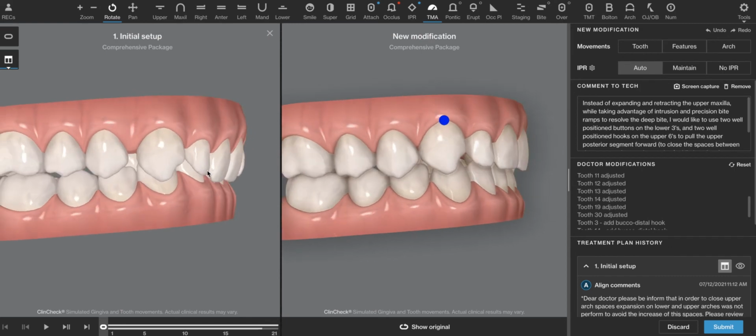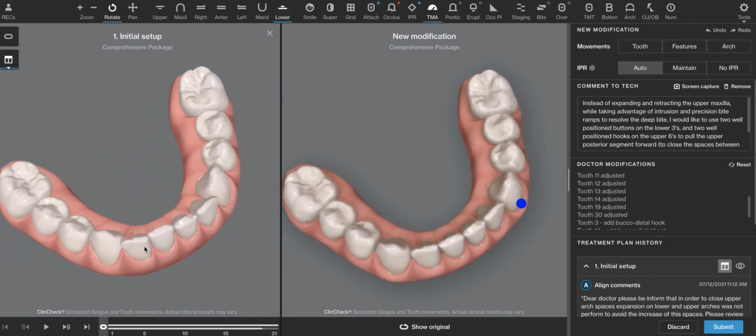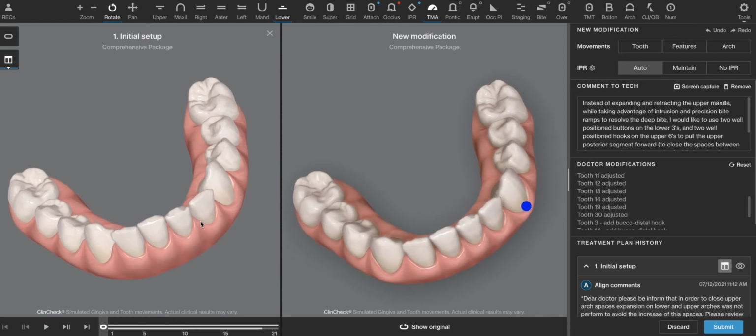This patient doesn't show signs of any parafunction. So if I'm going to take a look at the top of the teeth, I don't see any signs of attrition. I see chipping, but chipping is more a function of incoordination or maybe habit, and not parafunction. Parafunction, you would see more attrition, which is universal wear of the teeth on the edge to edge or posteriorly.